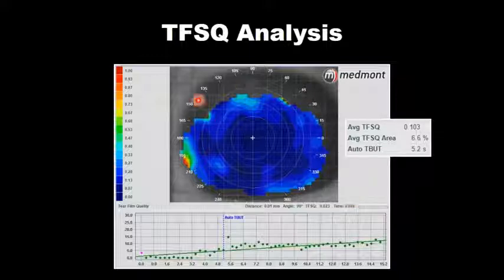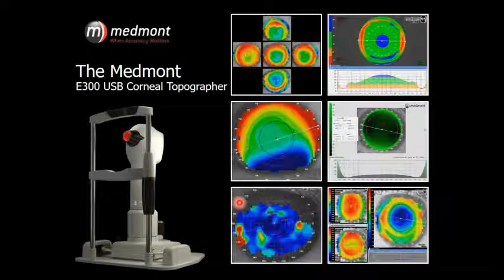As an example, what we're showing here is not the shape of the eye, but rather dark blue is highlighting where the tear film is ultra smooth. From one point to the next point of measure, there isn't an elevation change. The tear film appears very smooth. Where you see hotter colors, that's where the elevation of the tear film is changing.